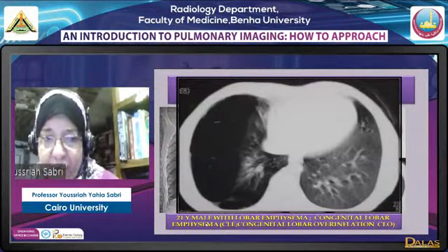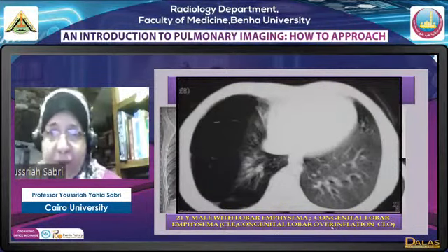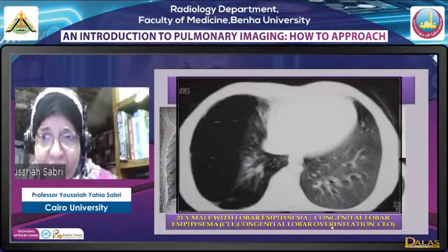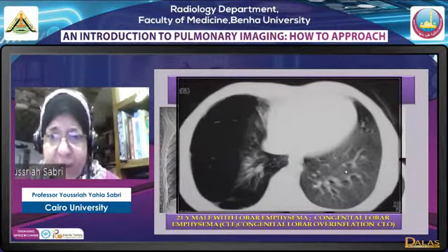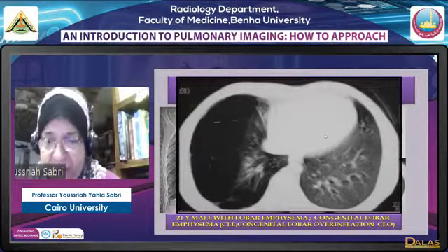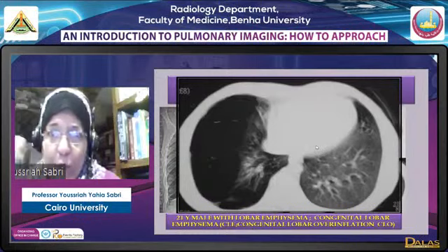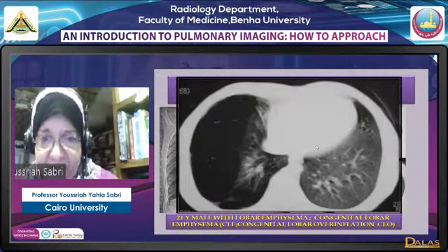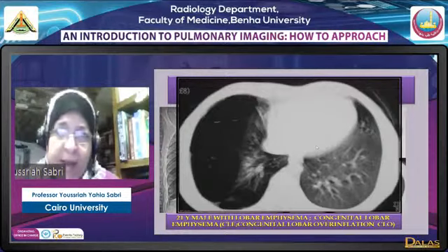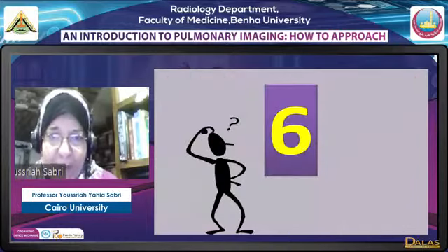And this was a 21-year-old patient with lobar emphysema. This is congenital lobar emphysema. Actually, this was the preoperative film of the patient, after the lobe was removed. He came to us later, but I have made a copy of this study. So this is congenital lobar emphysema. We have only one lobe markedly emphysematous, obstructive emphysema. It's a congenital cause. The presence of the other lobes some sort of balances the lesion.